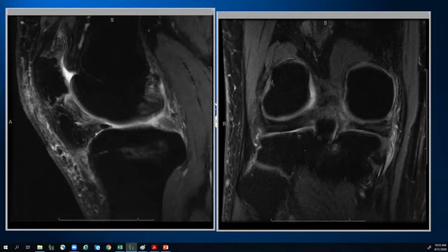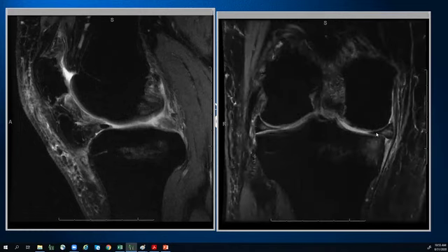All right, great. So we do have one. Okay, we're having a few answers in the chat, and all the answers are basically saying that we have a posterior radial root tear, which I agree with. There is a ghost phenomenon, which I agree with. And what's the complication that I'm trying to show on this image?